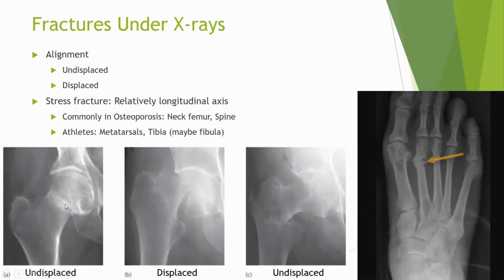The white sclerotic plaque on either side of the black line makes us understand that it has actually pushed in, making that fracture site completely smashed, completely within the fracture site itself. And the head is also pushed. Look at over here. It is completely pushed within the acetabular walls or cavities right over here.